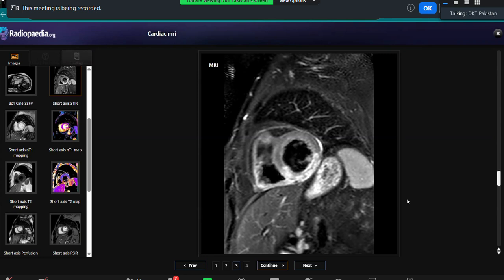Okay, good. Your diagnosis is correct. Again, the infarct is confirmed on the MRI, and the conventional angiograph, we do not look at the myocardium, they look at the coronaries. So you can see that, if you want to see. Can you tell me which area is affected, which territory?